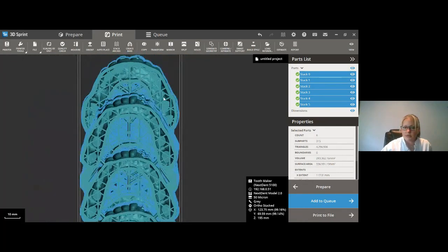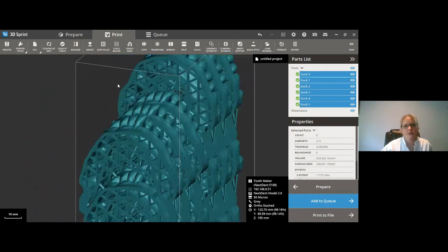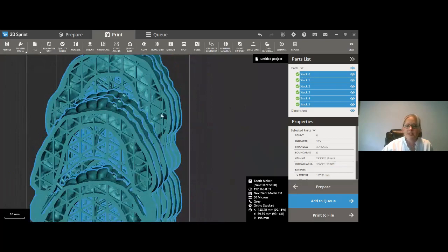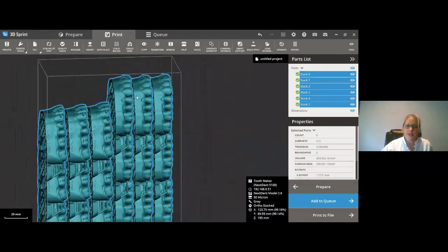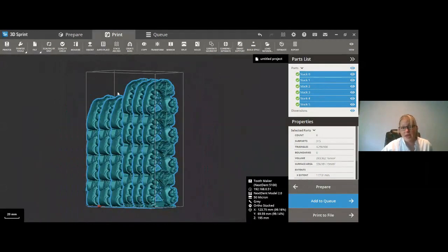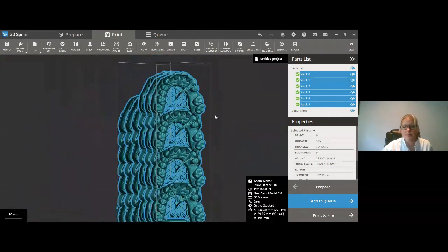Now, you can change these slightly if you need to, but we've run a lot of testing with different thermoforming machines and different thermoforming foils, and we found that this is a nice stable measurement that we've come up with here. So you shouldn't have any breaking models. You shouldn't have any collapsing of your teeth at all because we've filled those teeth in. Some people will even use this for perio and things like that. So if you need to grind on your teeth at all, we've filled those in. So this is kind of like a one size fits all as best as possible. Yes. Also, when you're going up to this max Z axis, you really need some extra stability, and that's why we've chosen the support style we have as well.